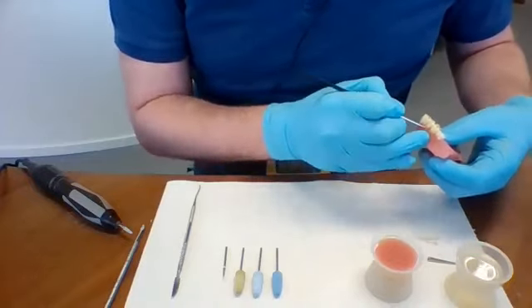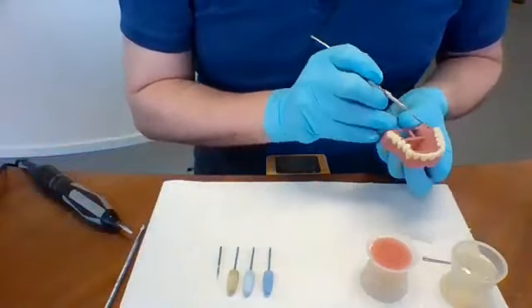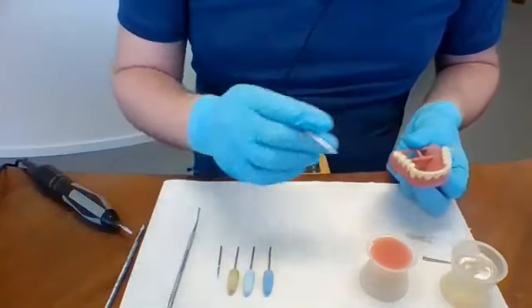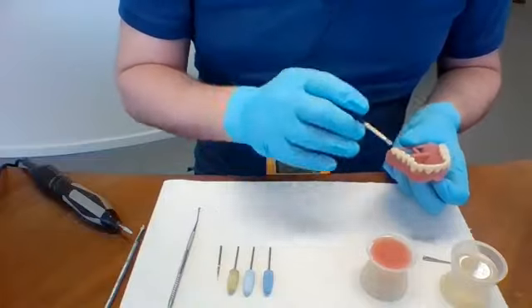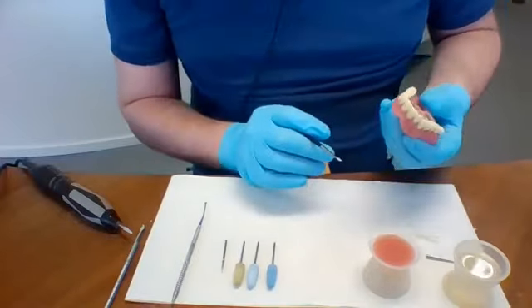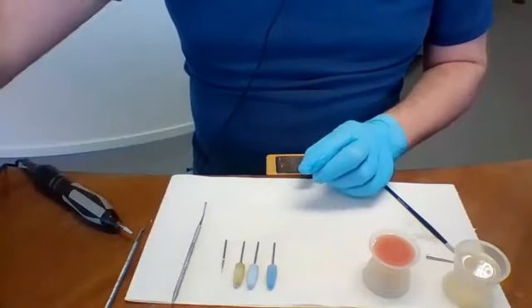If you have put too little material in it, you can add material by just placing it around and it will just flow in. You don't want air pockets in the material itself, so a little bit extra and then take out the excess from the incisal edges. So this is now ready to post cure, so I will put this away.